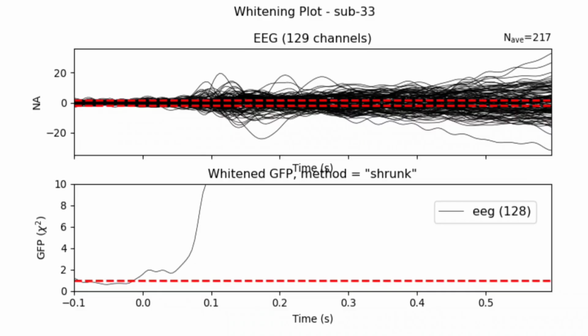What should you do with these? These plots have served their purpose as a critical QC checkpoint. Here is your action plan. Proceed with confidence. You have visually confirmed that the noise covariance matrices and inverse operators generated by your build inverse solutions.py script are valid for all subjects. You can confidently proceed with running your source space statistical analyses.